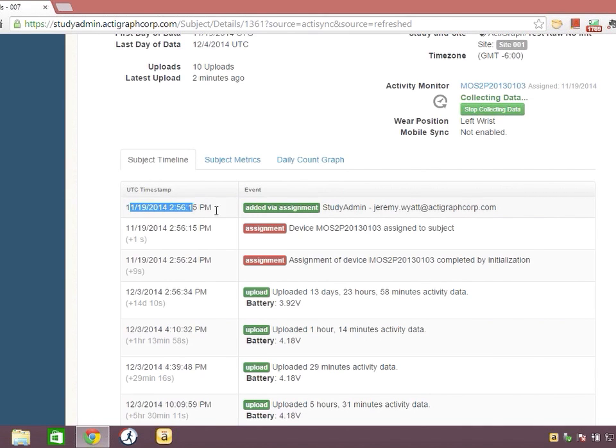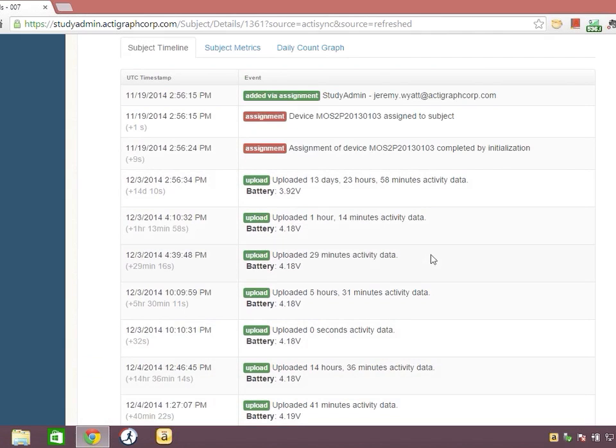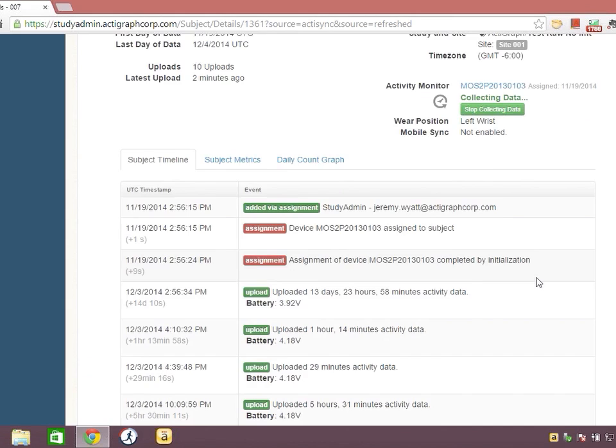So I know that on 11/19, this device was assigned using the study admin system by this user, and that is me, of course. And so I've got this history broken down by timestamp, and I know exactly where this device has been at all times. And if I'm using mobile uploads, I'll see the uploads come in through here, and I can audit that myself.